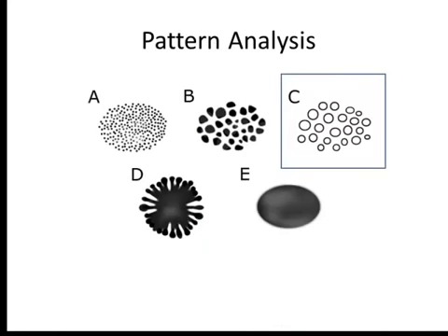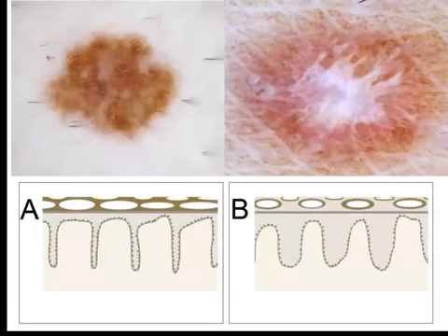This podcast is about the dermatoscopic pattern of circles. When we speak about circles in dermatoscopy, we have to differentiate between circles on facial skin and circles on non-facial skin. We will start with circles on non-facial skin.